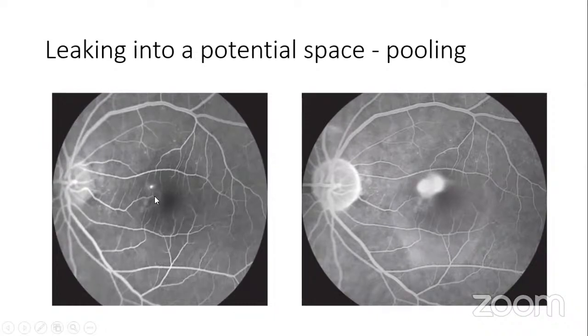So at this phase, you have an ink blot. It's a dot. That's to tell you that during the choroidal phase, it seeps through the RPE defects. So it gives you the dots, because the break is tiny.